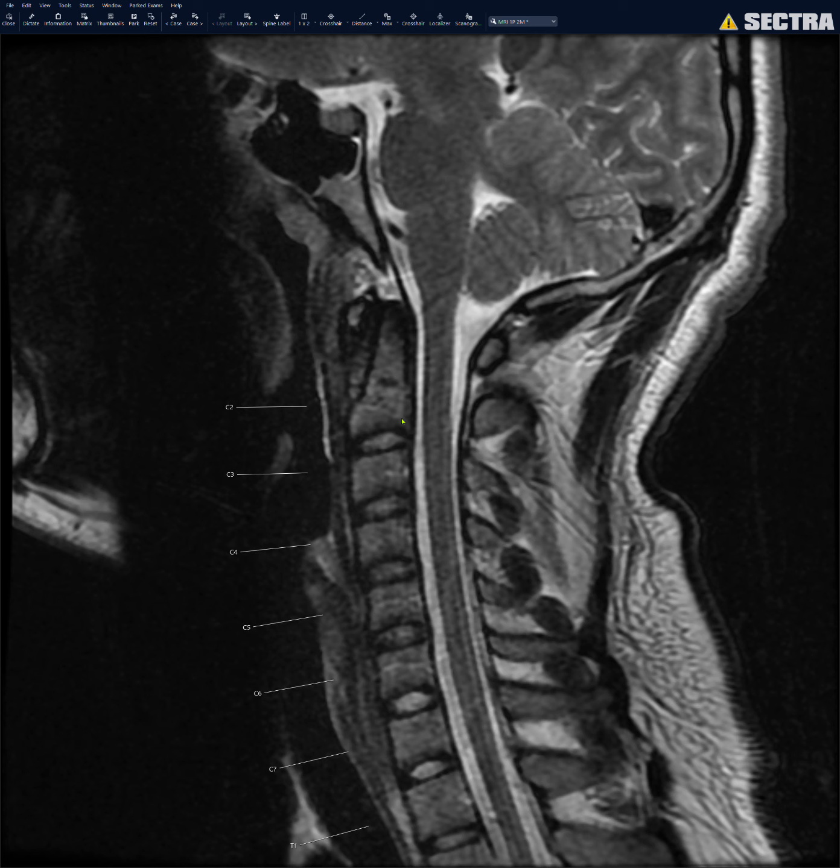The continuation of that is the tectorial membrane, so make sure that's also intact. And then I look at the ligamentum flavum. See that? Here, sometimes it's a little hard to see, but this ligament here should be intact. The continuation of the ligamentum flavum is the posterior atlantoaxial and atlanto-occipital membranes. Make sure that's intact. Okay, the ligaments look intact.